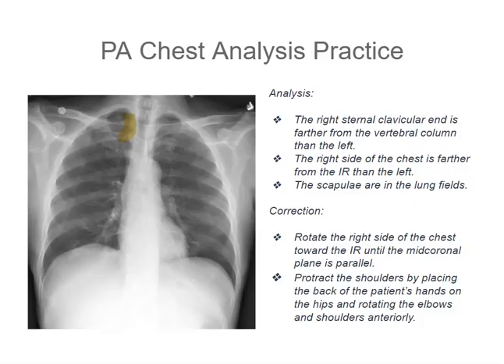Next, you want to determine whether or not the clavicles are demonstrated horizontal in the position of them and the manubrium. And it looks like they are around the fourth thoracic vertebra, so we are good on plane tilting. The last thing, and Merrill states in the evaluation criteria, is that the scapula should not be demonstrated within the lung fields, and they are demonstrated within the lung fields. So this should indicate to you that we need to take some corrective action and repeat this image.